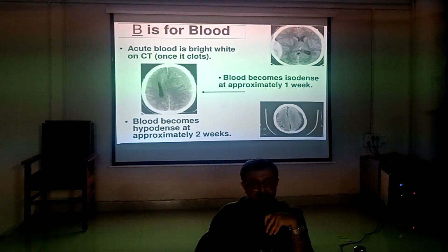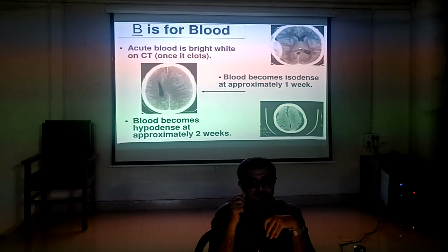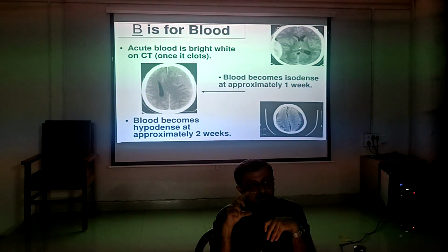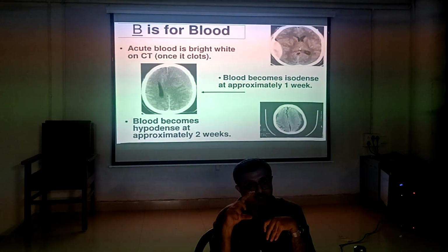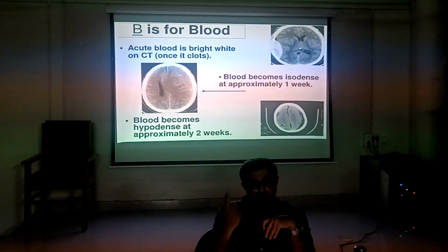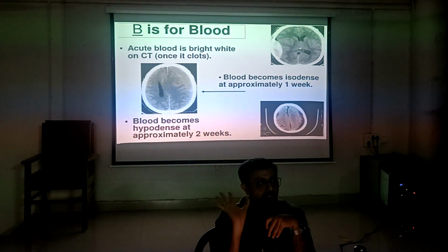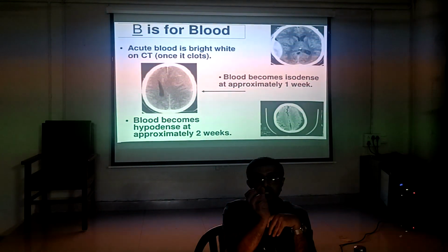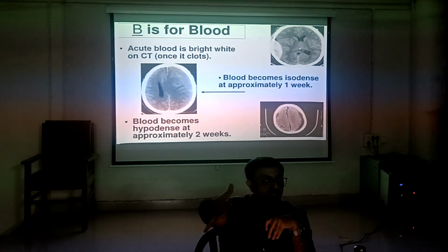This is EDH. It is extradural, between the skull bone and the dura. So it will be limited by the sutures. The suture lines are closed, and the dura is adherent to the suture line. Between two suture lines there is a space. So EDH expands transversely, SDH expands tangentially along the brain surface.